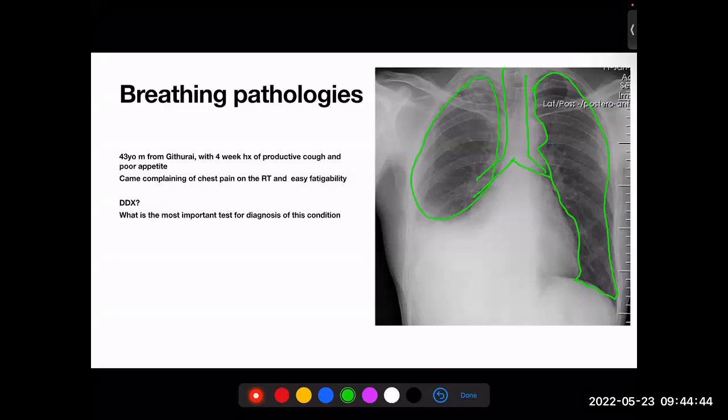There is blunting of the lower base. The costophrenic angle is not visible. And then there is also this opacification up here. What is happening? Are you seeing this meniscus? Fluid menisci, yes. Pleural effusion, maybe. It's not maybe. This is pleural effusion. Pleural effusion is the correct answer.